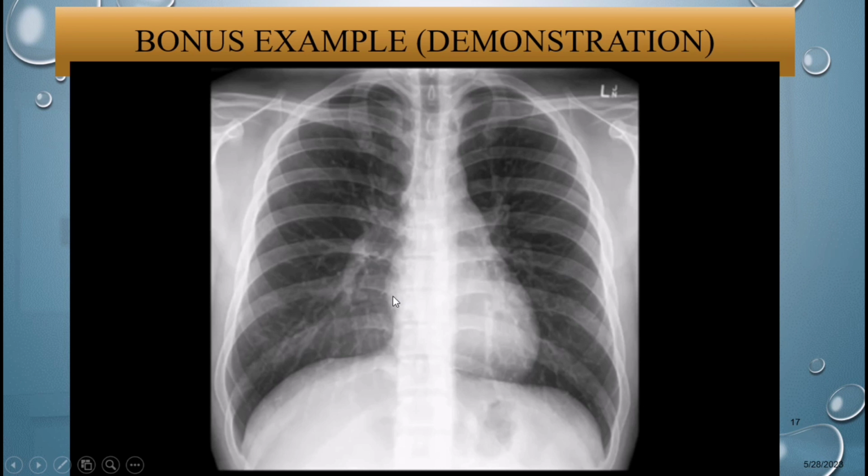Then you move them to this side, so don't change. That's the length of the cardiothoracic ratio. So after you put them this side, then you have to put the other one. If it was at this side, probably at this side, that's the half.